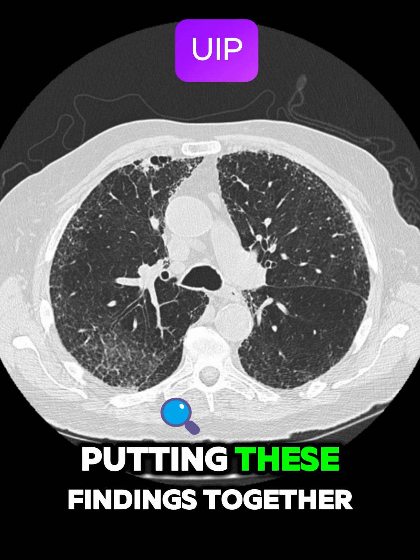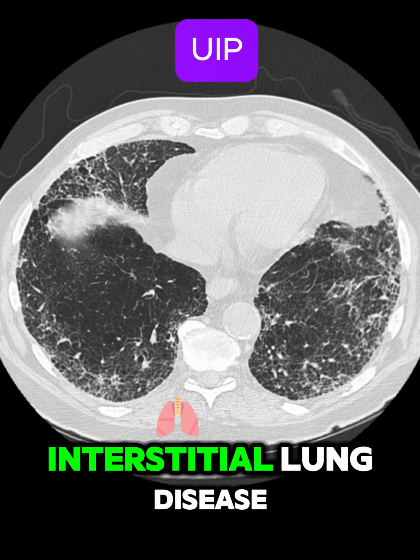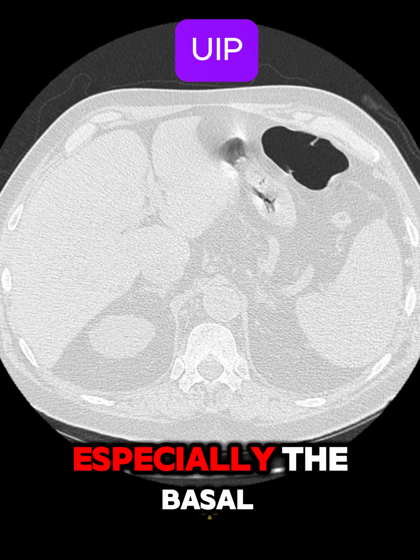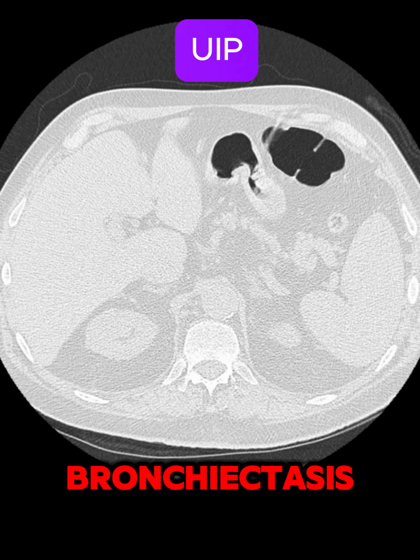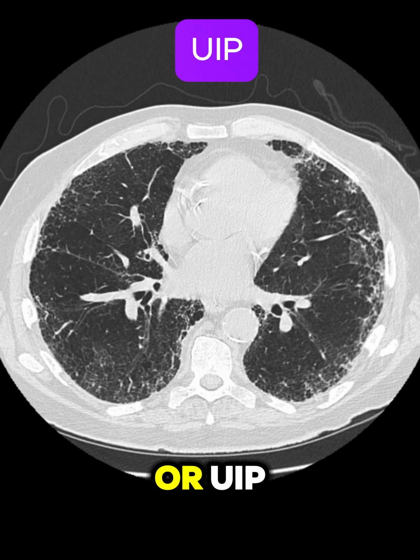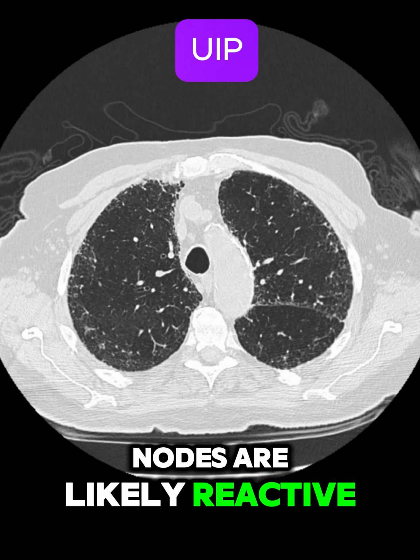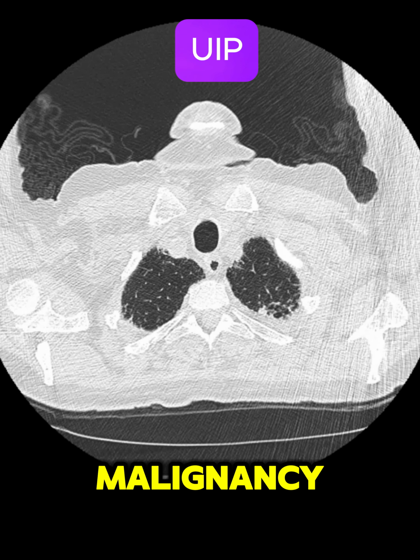Putting these findings together, this case strongly points towards fibrotic interstitial lung disease. The pattern, especially the basal honeycombing and traction bronchiolectasis, is highly consistent with usual interstitial pneumonia or UIP. The small mediastinal lymph nodes are likely reactive and not concerning for malignancy. Now let's consider the differential diagnoses.